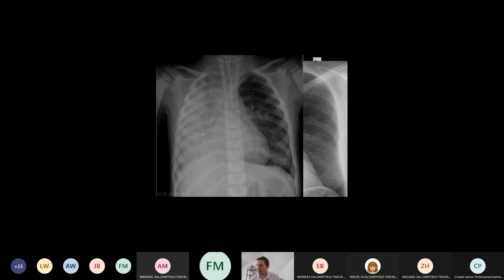Yeah. Perfect. So the only pathology that gives us air bronchograms is consolidation. So if you ever see these black lines, then it has to be consolidation. You don't get air bronchograms with masses or nodules or cancer. You don't get air bronchograms with collapse of a lung or collapse of a lobe. You don't get air bronchograms with pleural effusions. You only get air bronchograms with consolidation. So if you see these, you know it has to be consolidation.